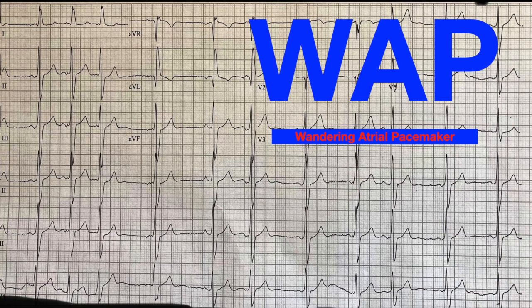Now you notice his heart is still okay. He's still beating normally, and this isn't really the guy's problem per se, but it's just an interesting finding. It's not truly sinus rhythm because it's not coming from the sinus node. It is a wandering atrial pacemaker. And you know that because I counted at least 3 different morphologies of P waves that you find here: the little pink one, the little green one, and then the red one over on the end. So, wandering atrial pacemaker.